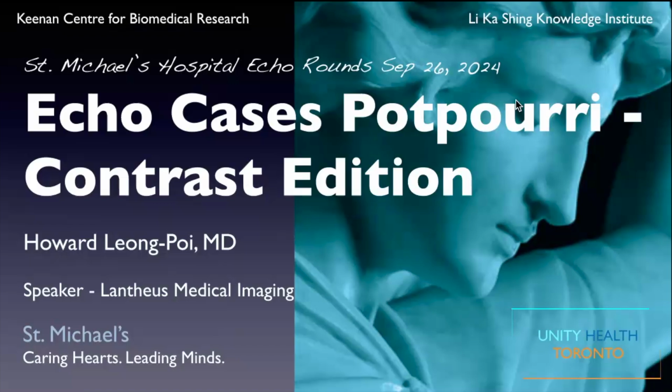Okay, all right. So this is very case-based. But hopefully we can discuss the cases and talk about optimization, and how to apply the use of ultrasound enhancing agents or contrast within your lab for standard applications and some sort of outside-the-box applications. So you'll see some cases in the lab. I pulled a case that was very old, you'll see actually. But it's a classic.